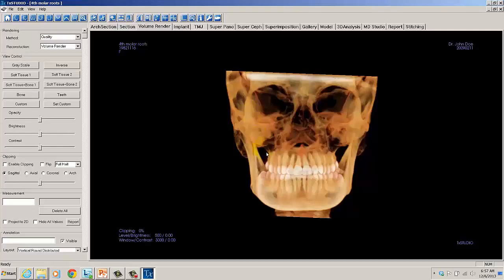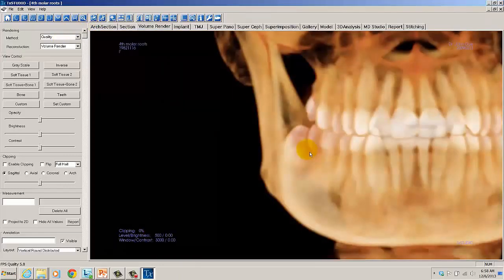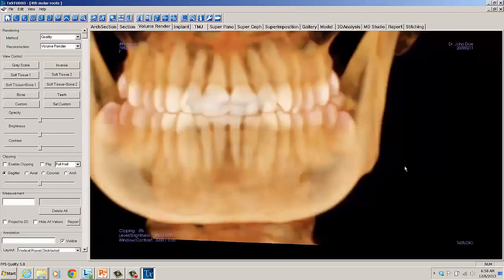These are, first, the Quick Zoom. If we go to the toolbar, we can find it represented by a magnifying glass icon. Left mouse click on that, left mouse click on an area of interest that we want to look at a little bit closer, and it's just a quick way to move around. We can click on that magnifying glass and left mouse click on a particular area of interest, and it would serve the same type of function that the pan would serve. So you might like to utilize that tool.